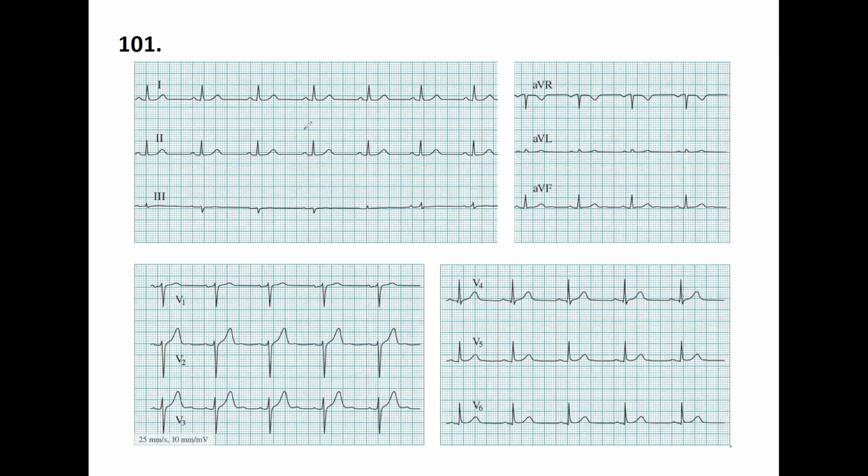This is the first one, so rhythmicity. As you see on this ECG, this is rhythmic. Okay, very well. Next one, about the rhythmicity, we can calculate the heart rate. Okay, the ECG basically is very good to calculate the heart rate, but much easier to, for example, feel the pulse of the patient. And there are several ways to detect the heart rate.